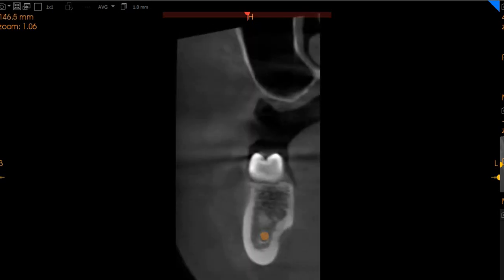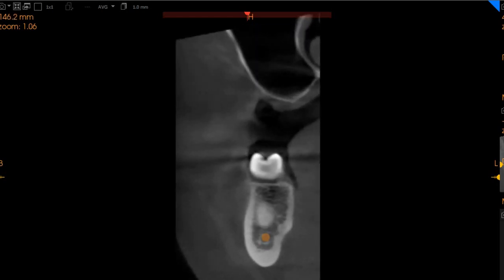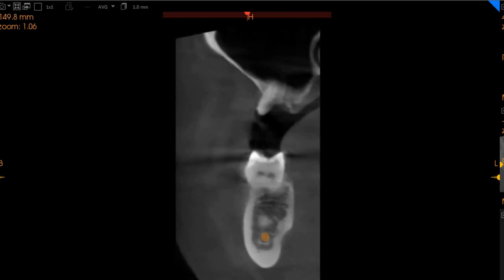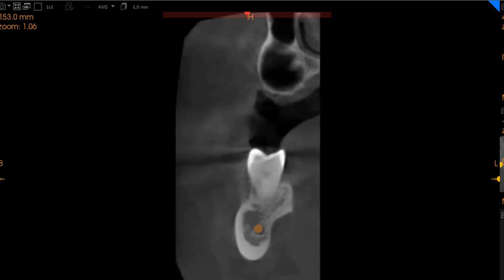The upper left segment is also, there's no bone here either, as you can see, no bone height, no bone width. So significant sinus lift will be needed in order to place an implant. The upper left 7, however, is a BDR, and again, once this BDR will be removed, significant grafting will be needed to place implants. Moving to the lower left 8.